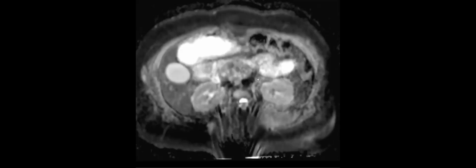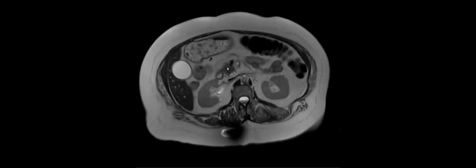Right there. Nice. Do you have the diffusion for the rest of the pancreas? That's fine. Yeah, so it's definitely darker. Rest of the pancreas not that bright, and then here it's brighter. I find it interesting, like here it looks much bigger than what I would have measured here. I don't know what you guys think, but I usually use either the arterial or the pre. I kind of try to combine them. I feel like sometimes the diffusion looks a lot bigger. I like the T2. I probably would have measured this whole thing.